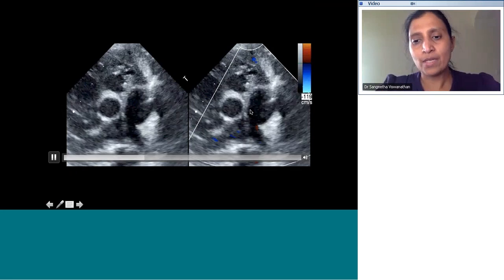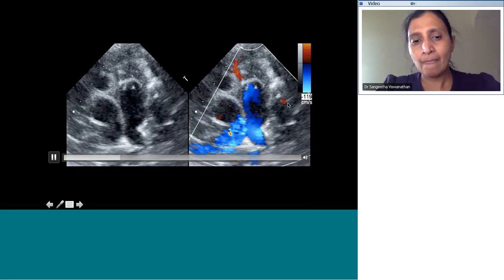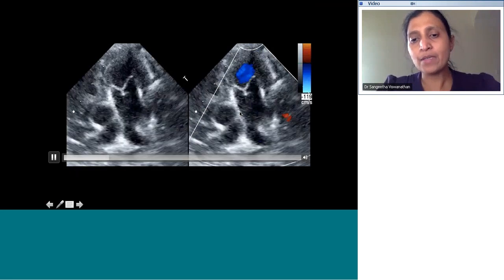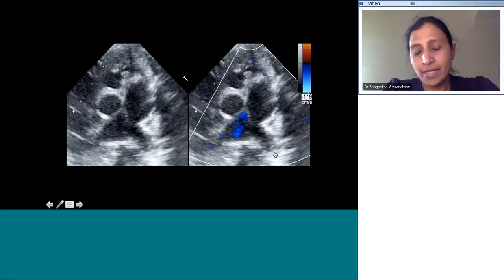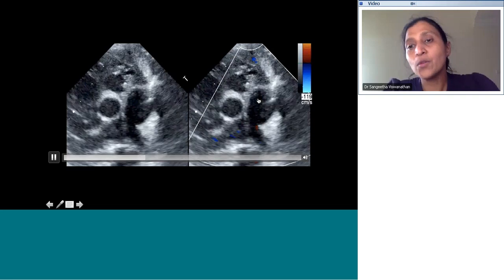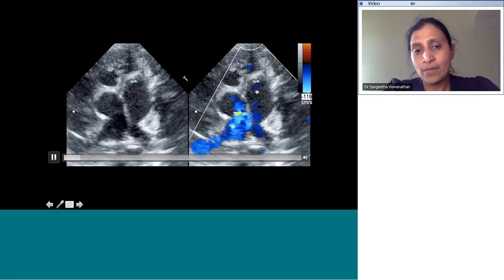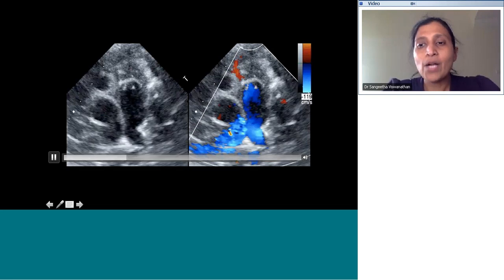What else can you see? Which appears a bit unusual, and it explains the pulmonary hypertension really. So, from the looks of it, it doesn't appear that there is any outflow tract obstruction. Okay, and somebody says AP window. You're kind of close, but this isn't an AP window.